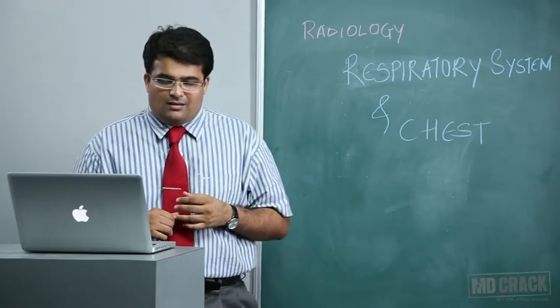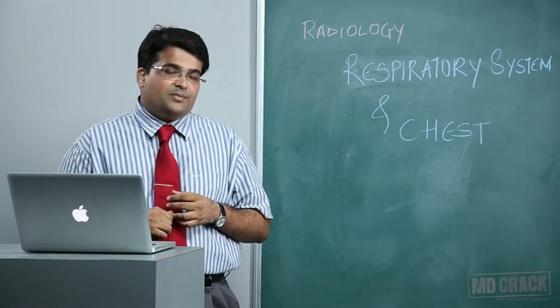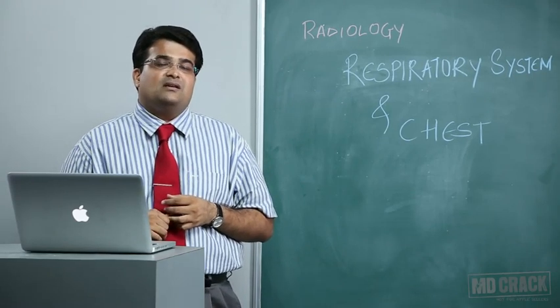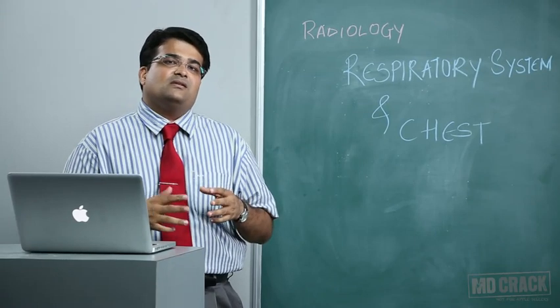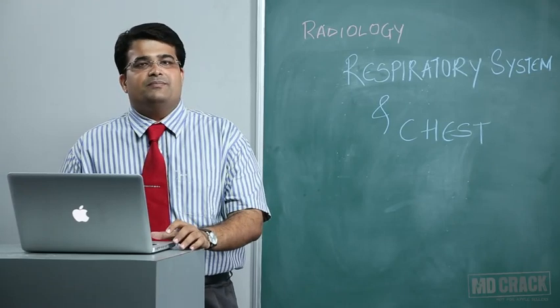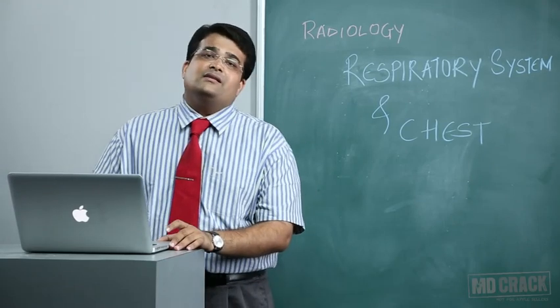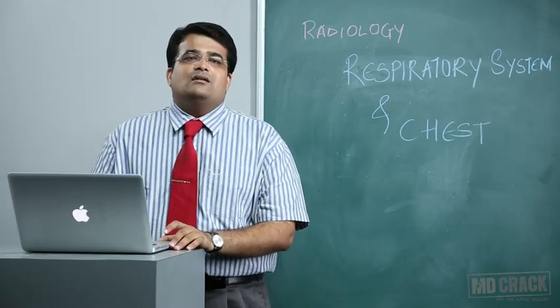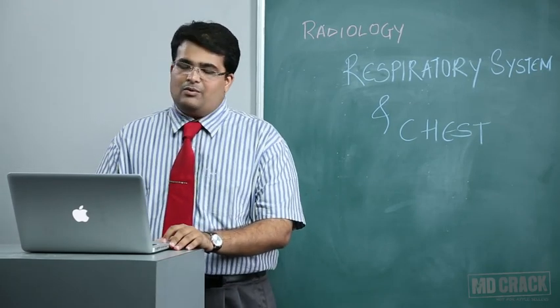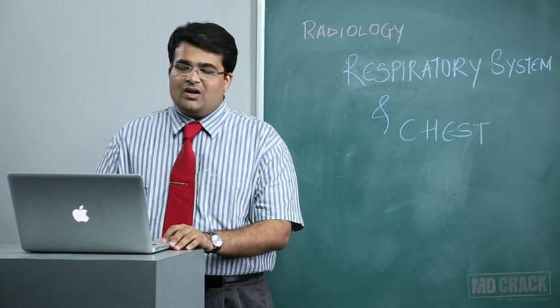Especially cavities due to tuberculosis are prone to develop something known as Rasmussen's aneurysms. You need to know this because they're quite a common cause of hemoptysis in a patient with tuberculosis. The treatment of hemoptysis due to these aneurysms is bronchial artery embolization.